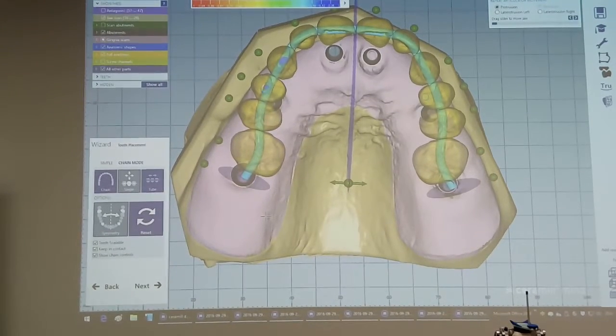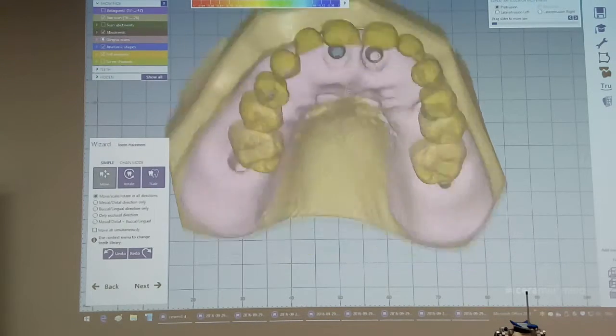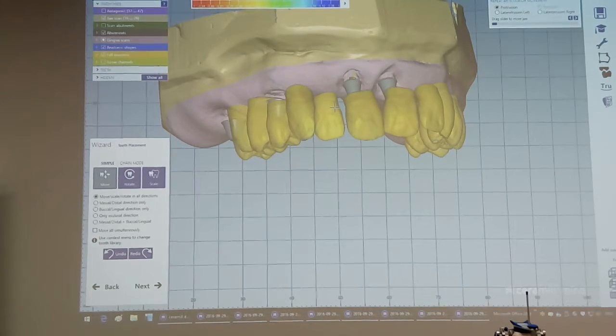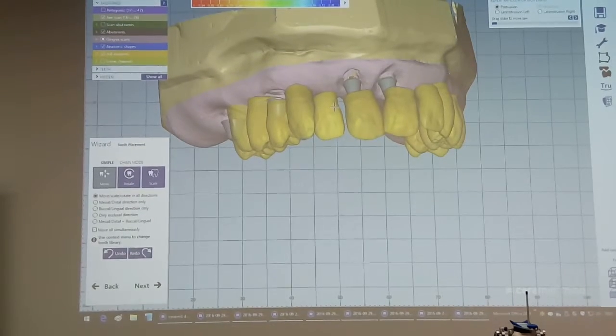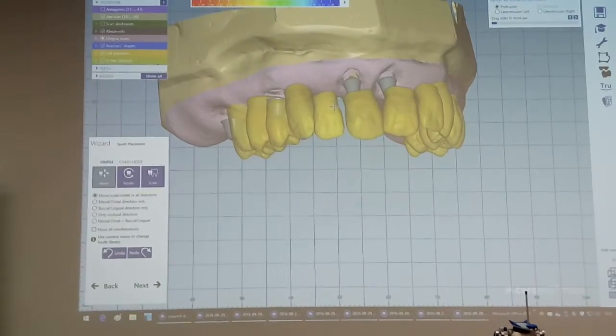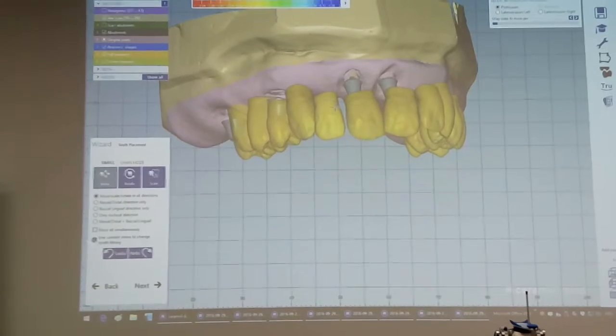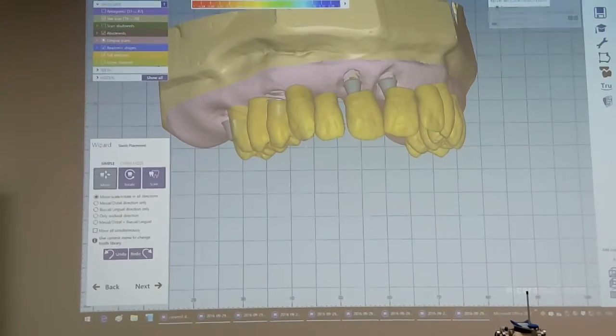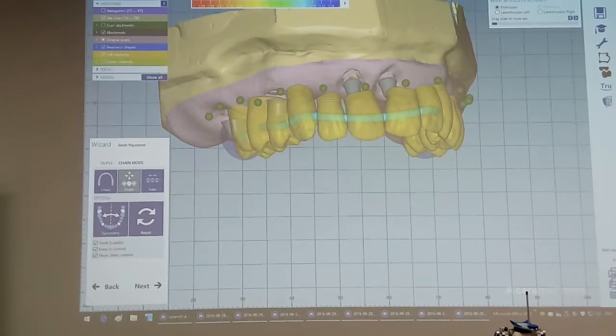In the past, with the last version, can you imagine, you had to move every tooth single, step by step. And now you have the possibility, if you get the basic information about the occlusion, you can say it's fixed with the chain, and then I'm going back to the single mode to adjust the occlusion step by step. Or I hope you can imagine.